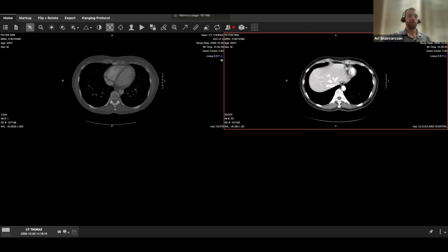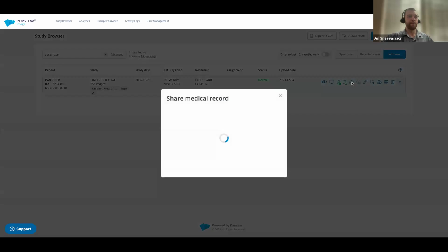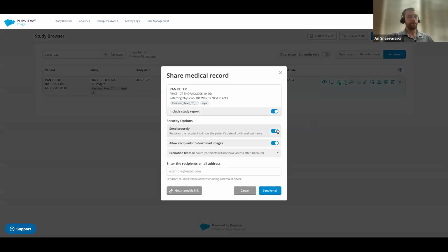So if we want to share this, we've got this imaging, we want to get this to our experts, maybe we're producing it for opposing counsel, we can come back here to where that image sits and click this share icon. With that, we're able to take the image and send a link of it right off to our recipient. I'll send this out to you, Les. Great.